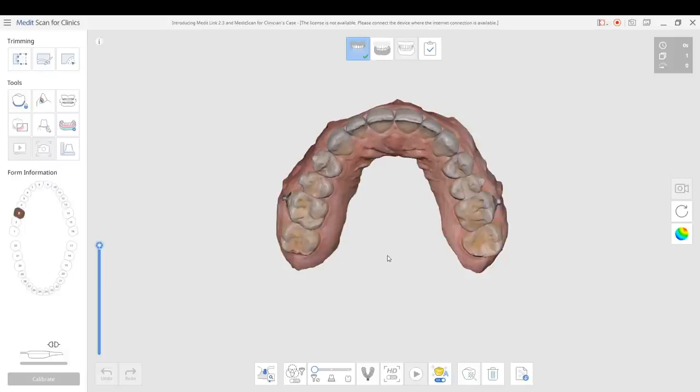It could be manufactured by the lab. We can turn on the camera and then continue building on this model. I don't know of another camera system that has this. It's an incredible feature to be able to bring in 3D models and be able to build on that, and we simply just don't need to keep raw files.